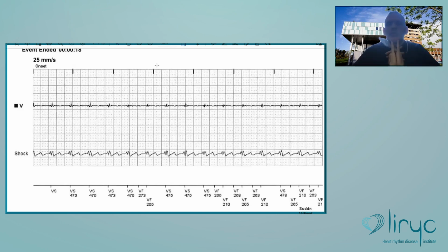It's surprising to see the amount of T-wave oversensing in Medtronic devices still, after pacing, for example. After sensing, so R-wave and then T-wave oversensing, it's not so important. But after pacing, you will see many of these cases. The same for Abbott devices. And for example, in CRT devices, that can really be a problem.